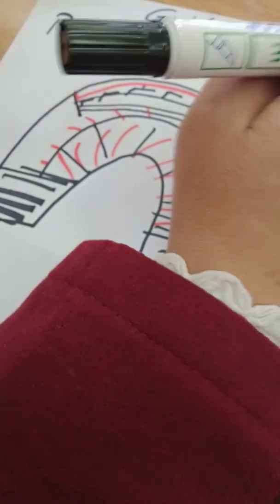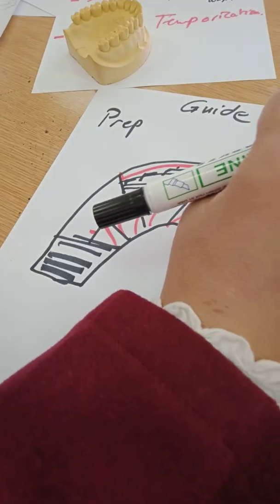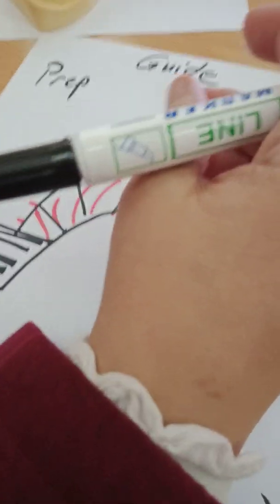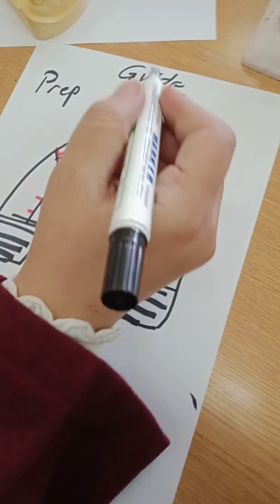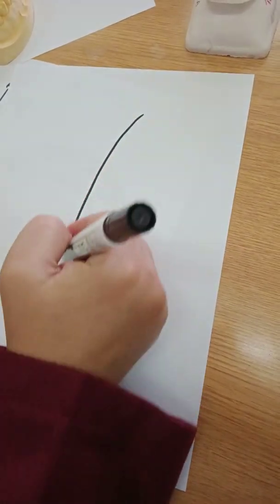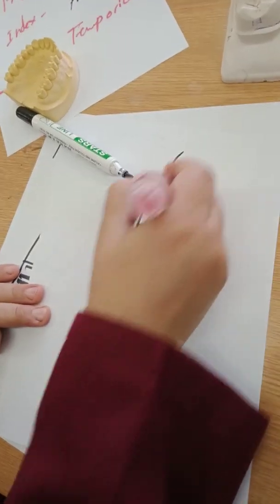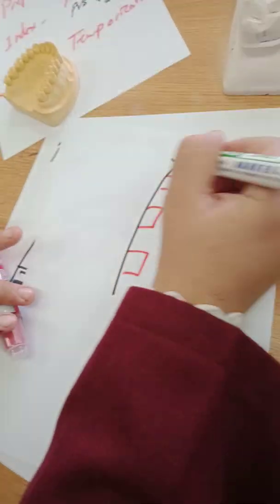So I'll put a link for the video that uses this preparation and talks about it. This is a preparation guide. So I would manage and concentrate on my preparation. Why do we need this? Because many times when we're using our depth gauges, this is the tooth surface, and we've used our depth gauges here, here, and minimally here. But what about this preparation here? How much did I prepare?